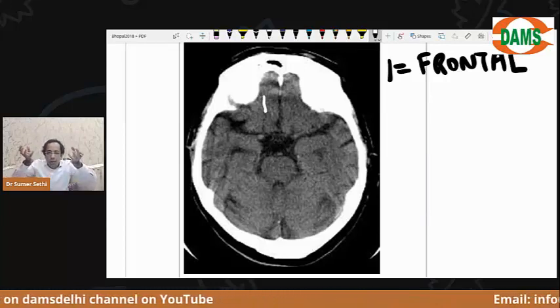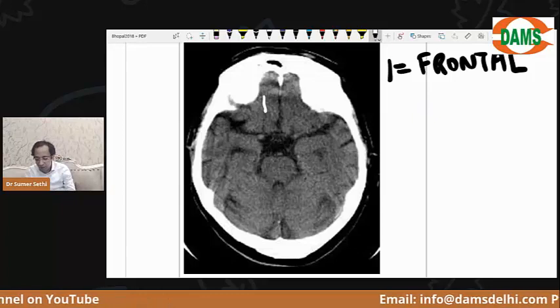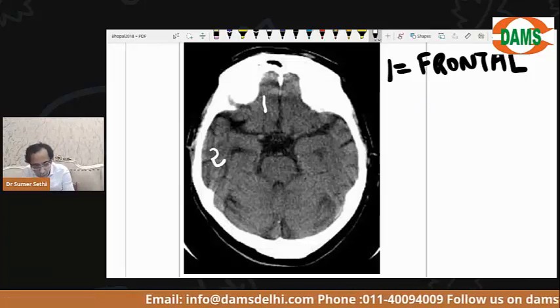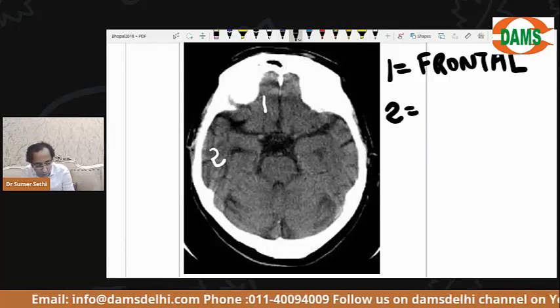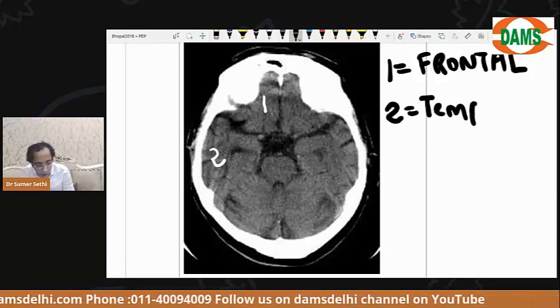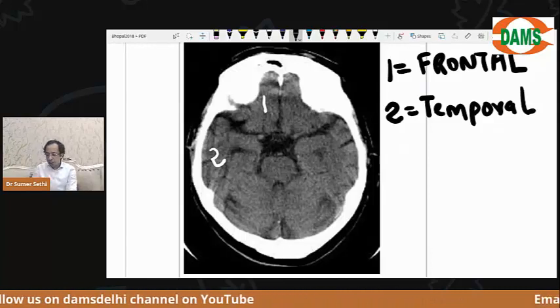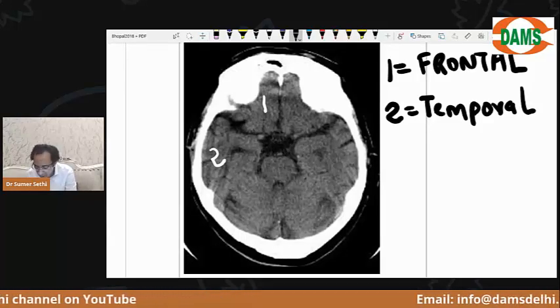When I go up, I can start seeing the frontal lobe. So one is frontal lobe, second is temporal lobe.